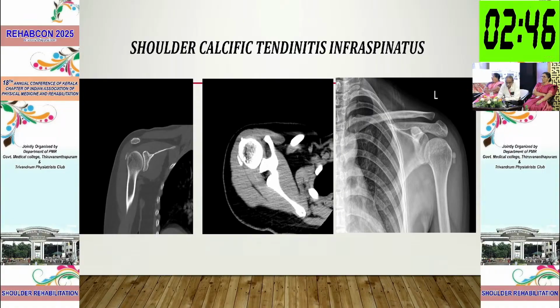Now, these are very important as far as arthritic lesions are concerned. Sometimes you can have subchondral lesions in the bone. Sometimes you can have periarticular erosions and all. Sometimes you can have loose bodies. These things, when an X-ray is taken, may create confusion, but in CT you can identify the anatomical compartment clearly. So that's just an advantage of CT.